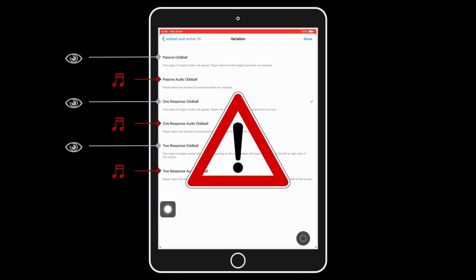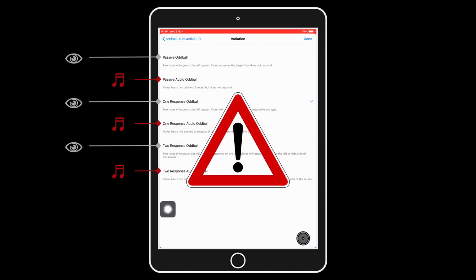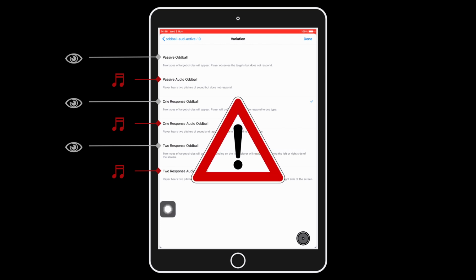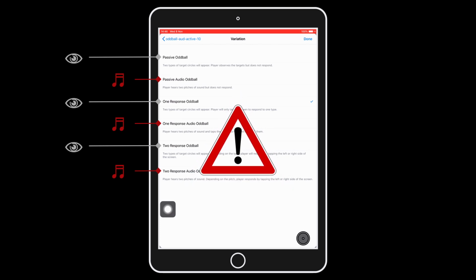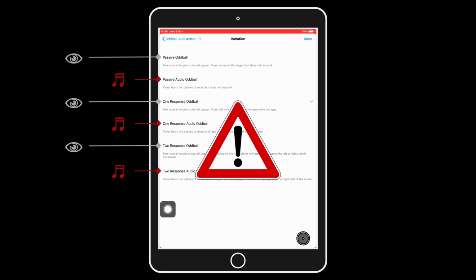So in the literature, the difference between active and passive oddball is essentially in the instructions given to participant. So what we call passive oddball is simply a scenario where the stimuli are presented to the participant who is explicitly told to ignore them. Now in Peer, the passive oddball can be used as true passive oddball only if you don't show the participant the on-screen instructions. The reason I'm saying that is because the instructions in these are actually set up for an active oddball with counting response.